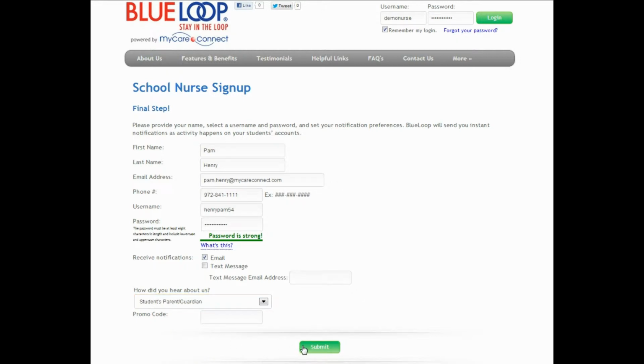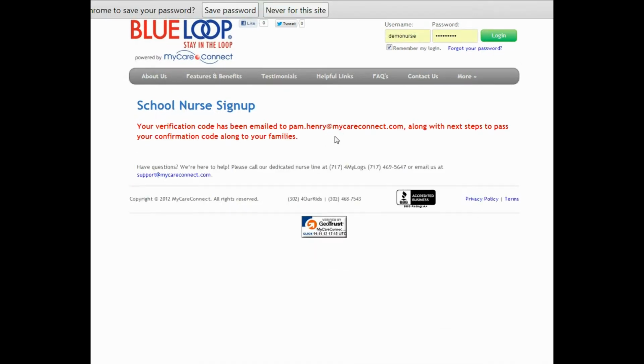I click Submit. So now the system lets me know that it has sent a verification code to my email address. That verification code is unique to me as a nurse as well as to my school. So in this case, I set up Johnson Elementary. If I have 2 or 3 families who have children with chronic conditions, I can pass that code on to my families so that when they are in their child's BlueLoop account, they would simply enter that code and be connected to me.